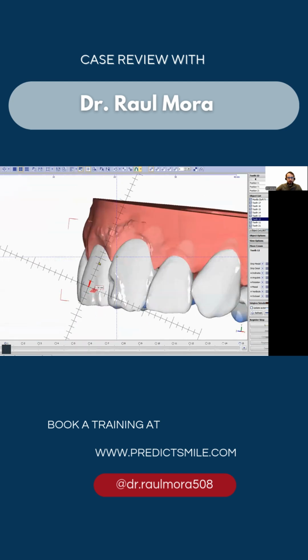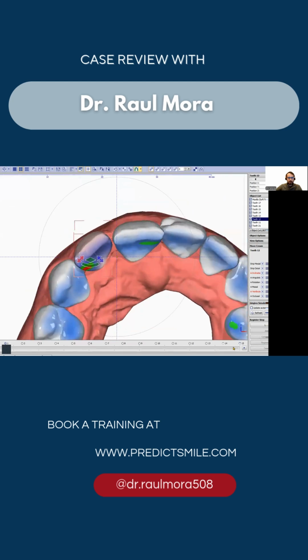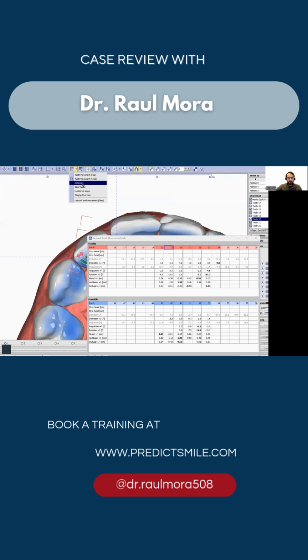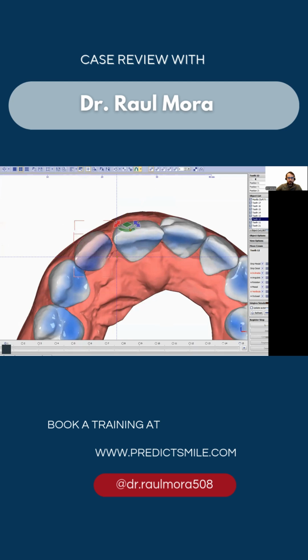So let's do it. And we have some sort of 6 degrees, so let's work around 4 point something. And we also do the hinge movement, which I don't remember how much it was. So let's check how much movement it has. And let me remove, I only need the movement table. It has 10 degrees.